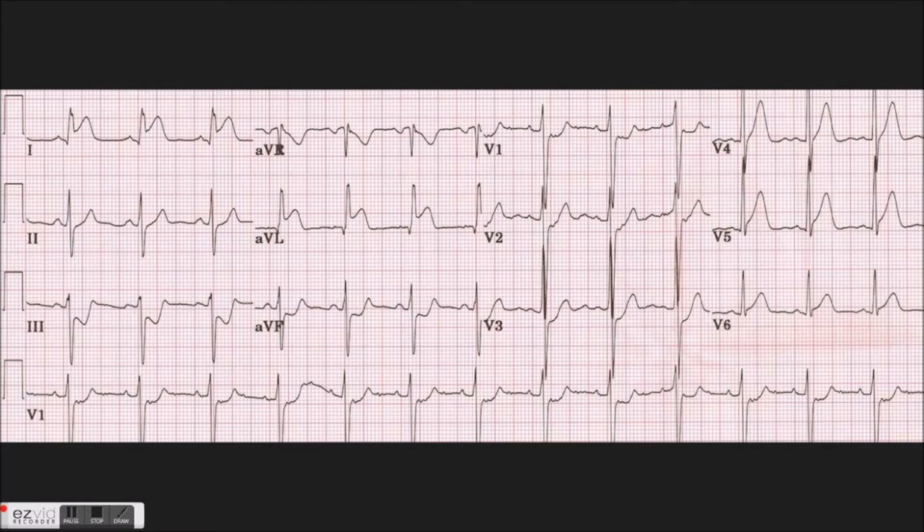So if you were to put your electrodes on the back of this person, when you looked at the posterior wall of their heart, you would see ST segment elevation. So again, a left circumflex artery dominant patient, further complicating the matter. It is a larger MI than if it were a simple high lateral, right? There is more ischemia in the heart, which is obviously more dangerous.